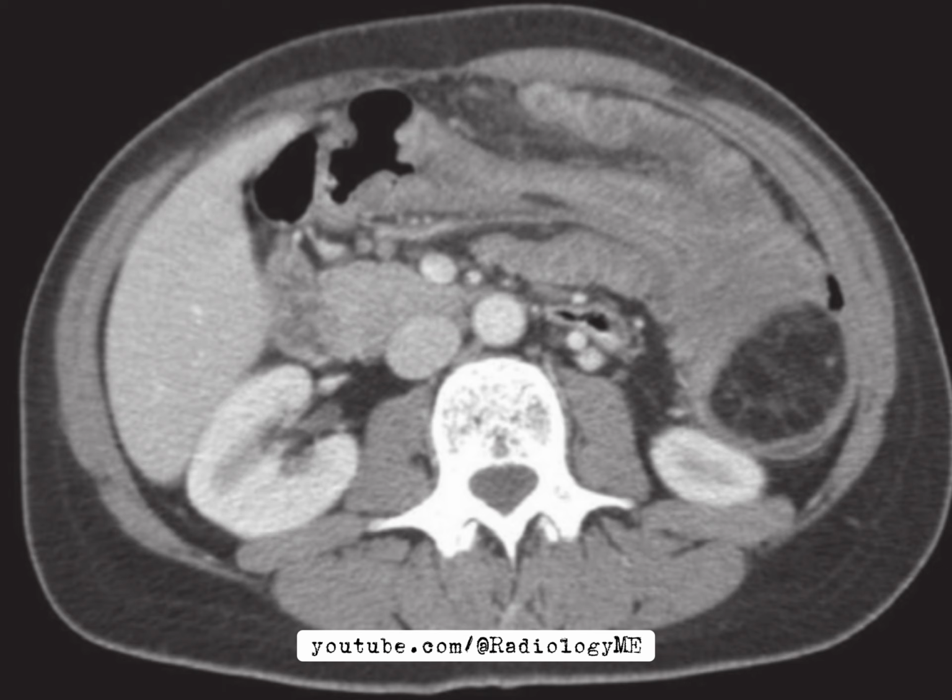When it comes to diagnosing intussusception, ultrasound is particularly helpful, especially in the pediatric population. You might hear terms like pseudokidney or target sign when discussing ultrasound findings in intussusception. Essentially, the pseudokidney appearance is created by the intussusceptum being the center and the intussuscipiens forming the outer ring, creating that classic target-like image. However, ultrasound can have its limitations in adult patients, especially if there's a lot of bowel gas or if the patient has acute intestinal obstruction. That's where CT really shines.